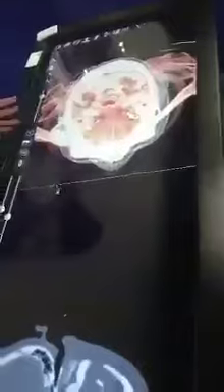And you can also add in some vasculature if needed. And you can also bring it back down. There's other ways where you can utilize this, where I bring in transparent soft and hard tissue. And so in this case, you still see where the clips were placed.